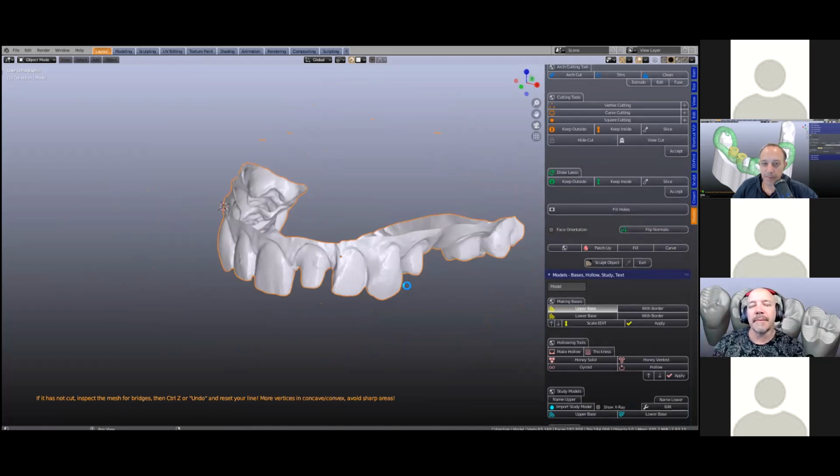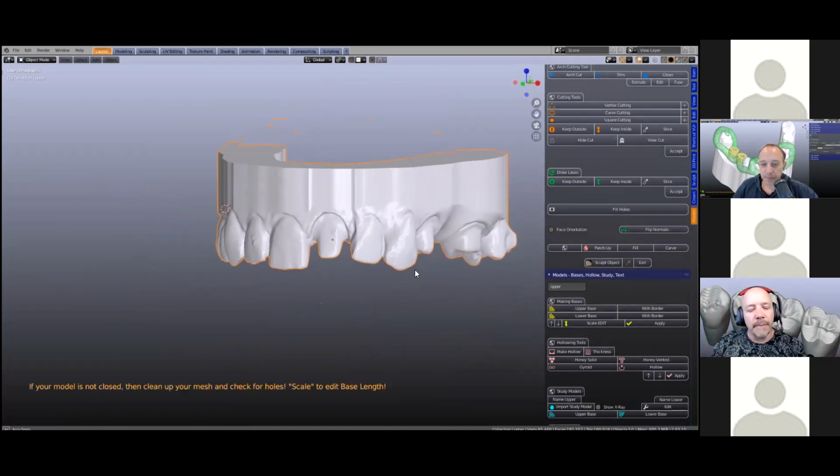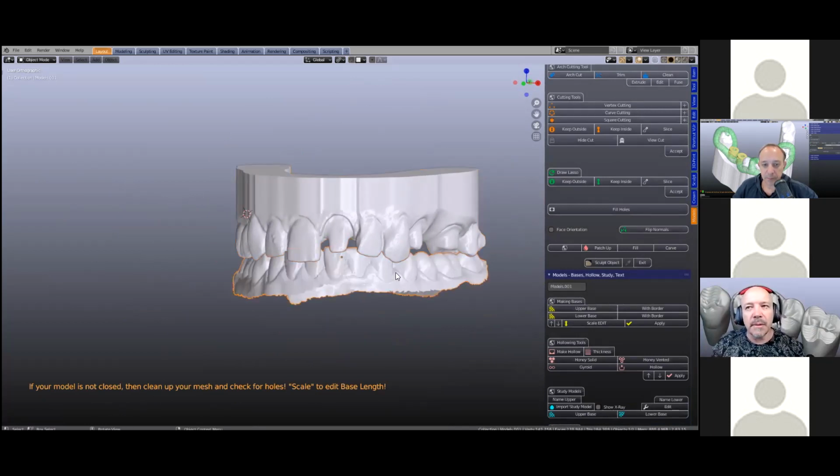Okay. I'll just want to do a hollow as well, because that's the next on the line.